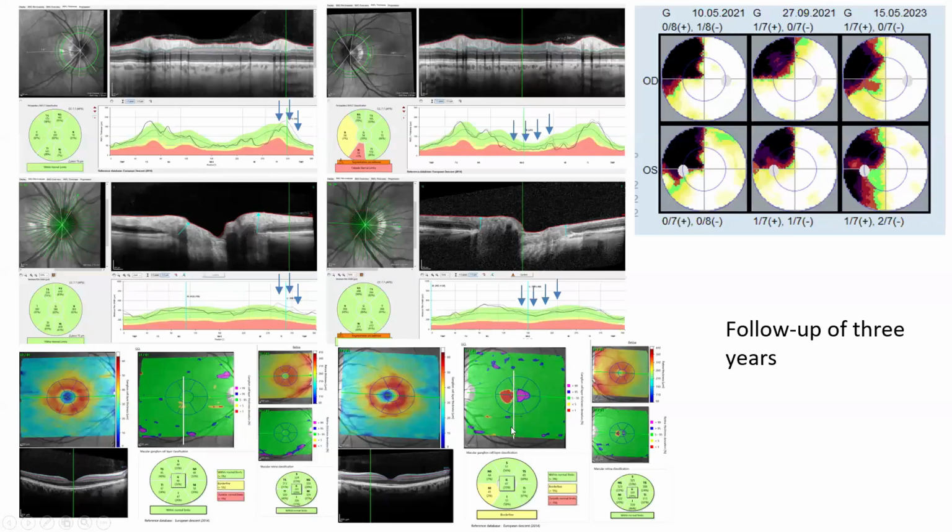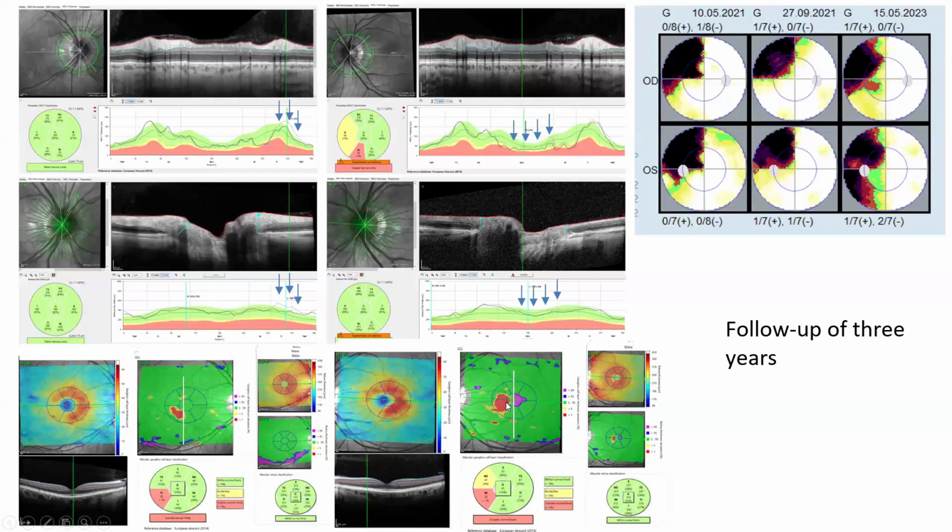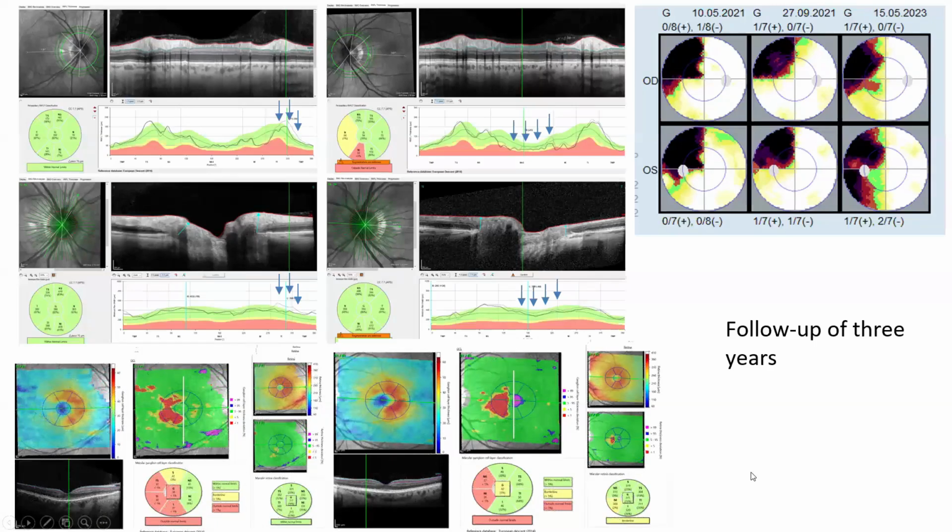Look at the vertical orientation. On the right-hand side, on the right eye, the temporal ganglion cells don't show too much. Then we continue in time, and you see that here the nasal defect becomes a little bit larger. And then the temporal defect also appears in the course of the follow-up examination. You will realize that the defect grows larger in the follow-up, although the tumor has stopped and doesn't grow.